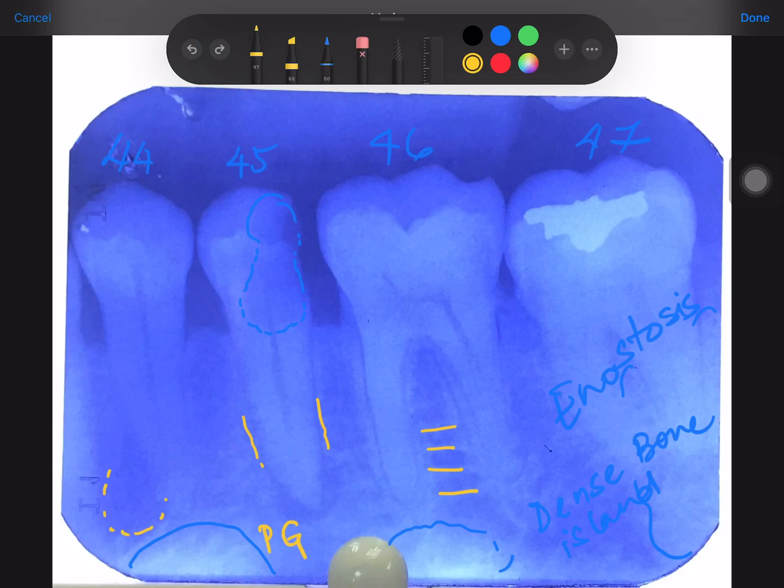Lower premolar root apices, ill-defined radiolucency. If it's a pair, say it louder. What do you think it is? Periodontal abscess. Are you able to see bone loss? Not really. Then how can it be a periodontal abscess? There's no bone loss. Bone height looks reasonably okay here. So what else is it? Think again. Since this radiograph was taken for the molar regions, this area probably is not very clearly seen, but you can still make out that there is some fuzzy radiolucency here.